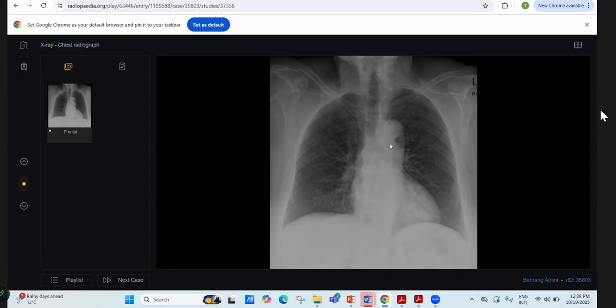So in summary, I'm looking at the rest of the lung parenchyma. There are a few reticulations. Reticulonodular changes are seen in bilateral lungs. They may be projectional, or the patient may have any history of disease. In my routine practice, I would zoom in on the image and adjust the windowing to confirm these findings.